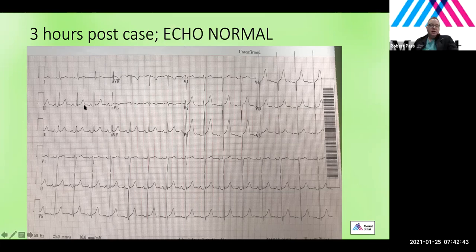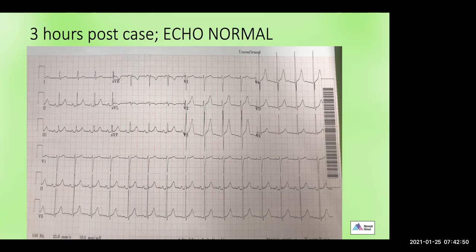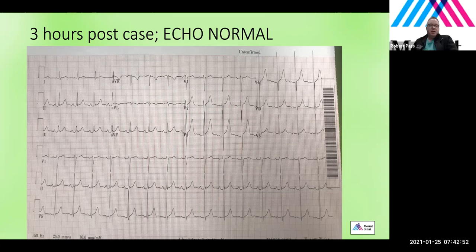I don't know, Perna. I think that what we have here maybe is some kind of a repolarization abnormality. It could be related to T-wave memory from having had pre-excitation before. The computer thought it might be pericarditis. Could be pericardial irritation related to all the burning that we did. It's hard to know. It sort of looks like a little bit of ST elevation in the inferior leads here, as well as in some of the other leads, here and here.